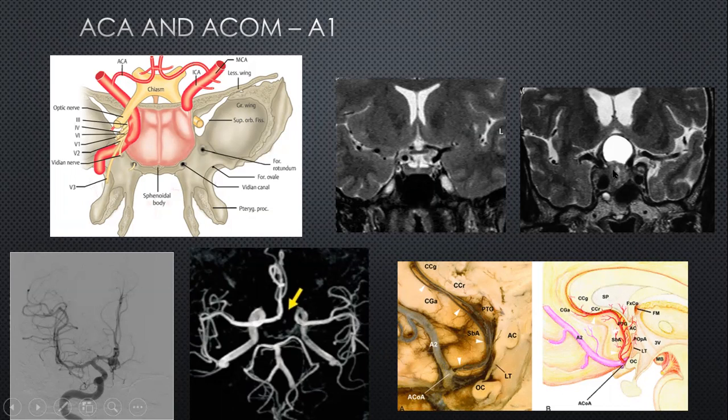And this is another patient with a large cystic tumor, and you can barely see the anterior cerebral artery, which is significantly stretched over the apex of the dome of this tumor, and hence much more liable to injury if not identified during transsphenoidal operations.